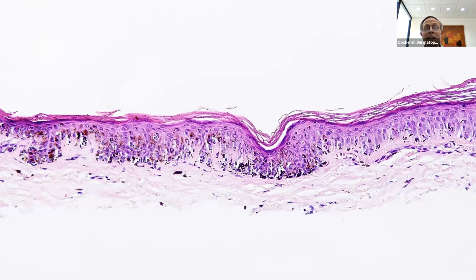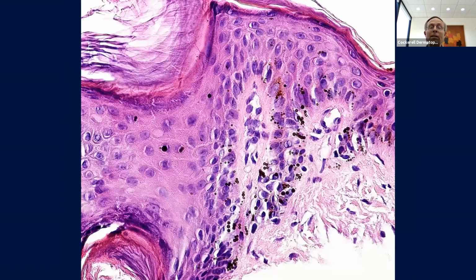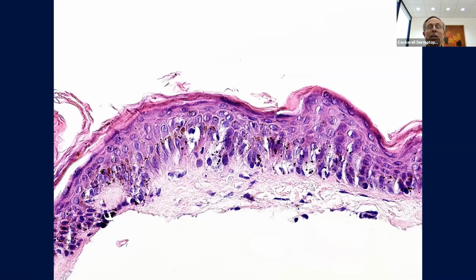Okay, another example, melanocytic lesion here. Cells are arranged at the junction. A little bit of coalescence, a little bit of hyperchromaticity, a lot of melanin in here. We see these lesions all the time as well. It's got a lot of melanin macroglobules, which is kind of interesting. It used to be a common finding that we would talk about in neurofibromatosis.